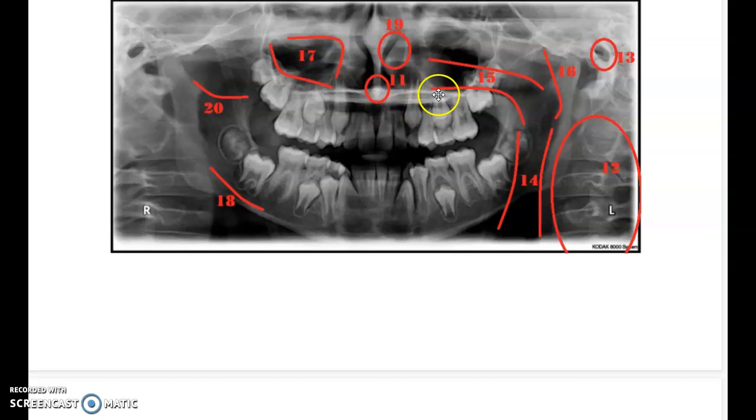And you can see it here too. That's the airspace right there. Not only these, but also this one. All right. And then number 16 is the nasopharyngeal airspace, which is a diagonal radiolucent band located superior to the radiopaque shadow of the soft palate and uvula, which we can't see as much here, but it's around this area right here, radiolucent band.